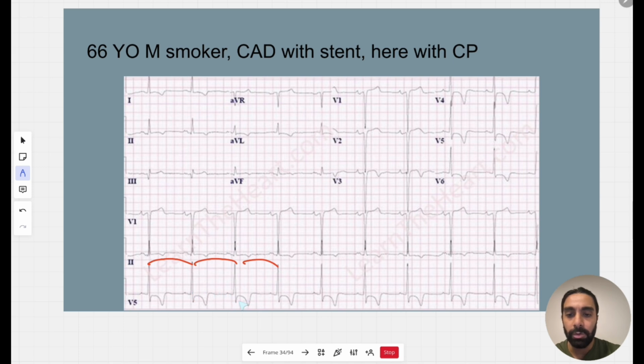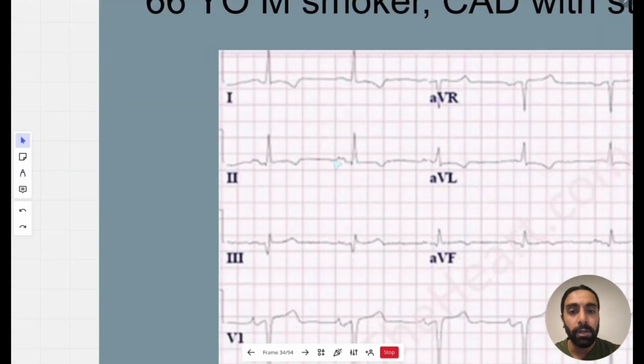And then of course you're starting to see some abnormalities as you pick up on this. Remember I said it's not linear, how you approach EKG systematically. And look at lead 2. So this is what I was talking about. You get that bimodal kind of Mickey Mouse type of sign, not Mickey Mouse, but 2 mounds across it. So that's left atrial enlargement more likely.